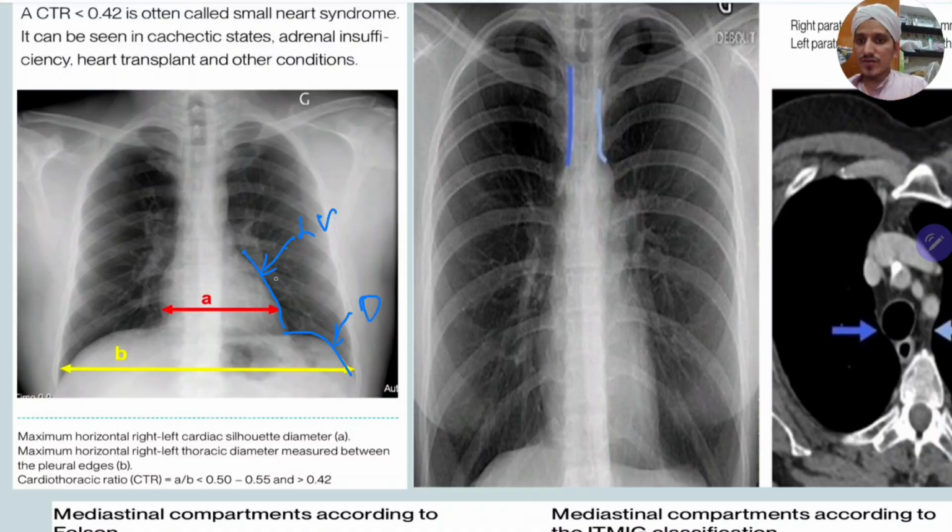Okay, so when there is left ventricular hypertrophy, this left ventricle will be pushing the dome of the diaphragm downside. So this obtuse angle will become somewhat like this. It will go towards the perpendicular side. The obtusity will be lost when there is left ventricular enlargement.